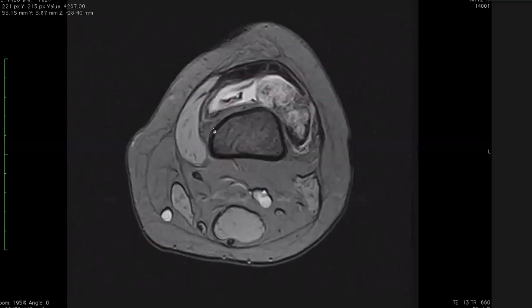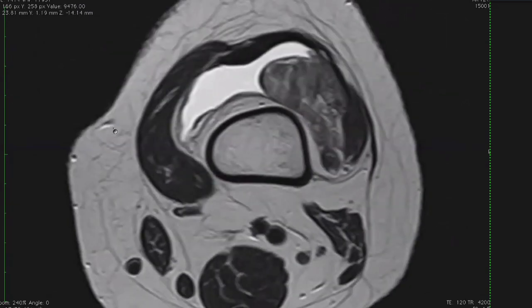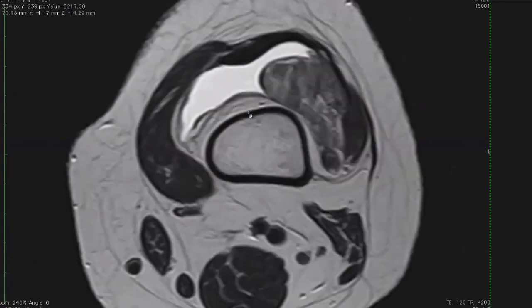And the other thing is that this is the lesion. Whenever you see an intra-articular nodular mass-like abnormality, particularly in the knee, think of this. You can see it around the ankle too; it can happen in any synovial joint. It's been described in case reports, but the commonest, I would say 70% of PVNS, happens in the knee. Painless, swelling.